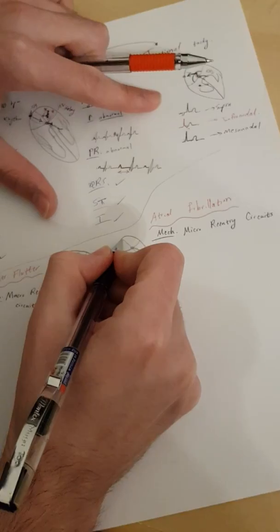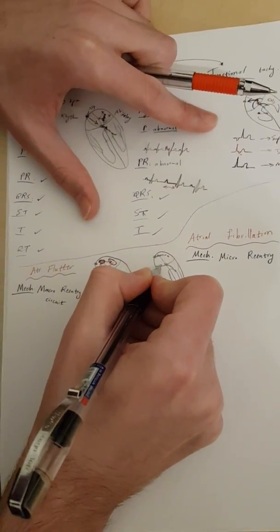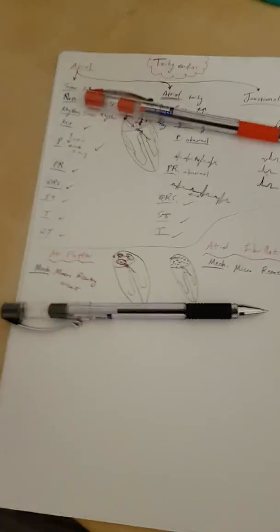What does this mean here? The atria is divided into hundreds or even thousands of micro circuits that will depolarize on their own. It's like this. So if this is the atria, instead of 1, 2, 3 as we said in flutter, here it's just going to be like this. It's like trembling. So you even see it like this trembling. That's why you see the ECG like this. So this is just trembling.